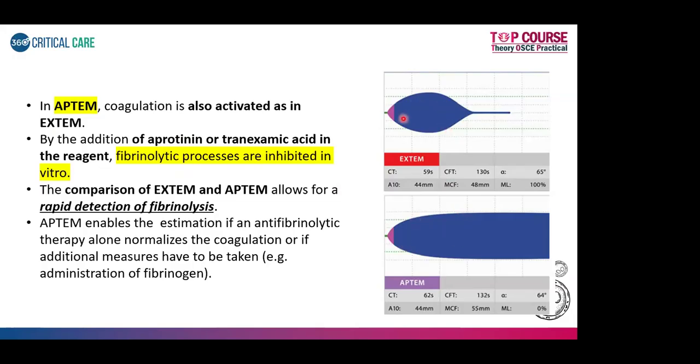So if this abnormality in EXTEM is corrected in APTEM, that means there was hyperfibrinolysis. It's like a check and balance. You know the problem, you give the treatment, and see if that treatment is helping the clot formation get back to normal. So this is the check and balance for hyperfibrinolysis. You compare it with the EXTEM.